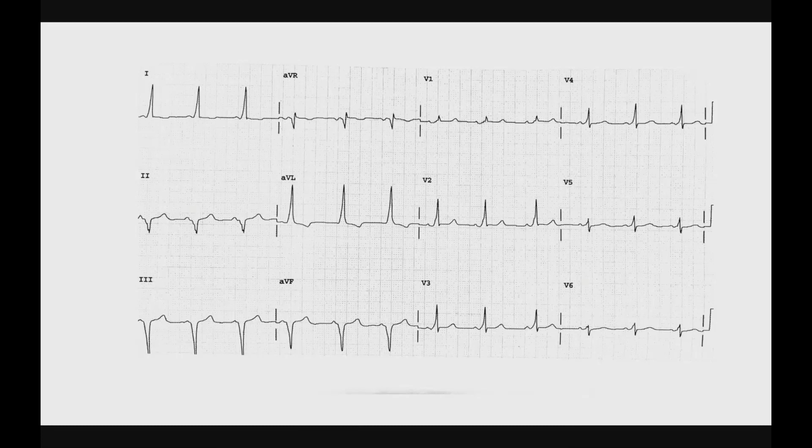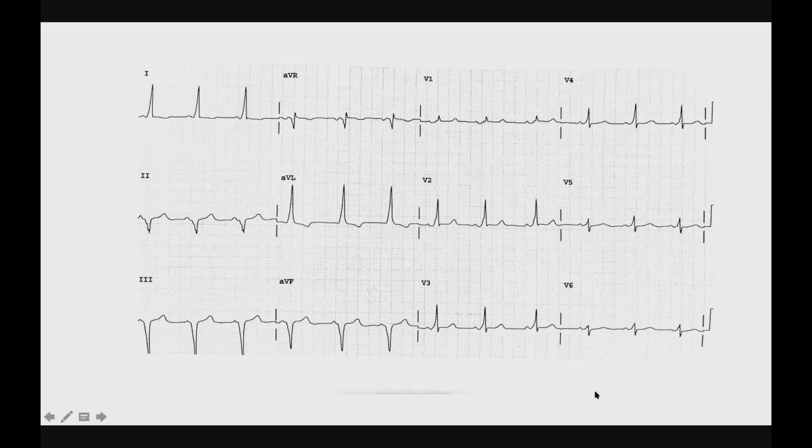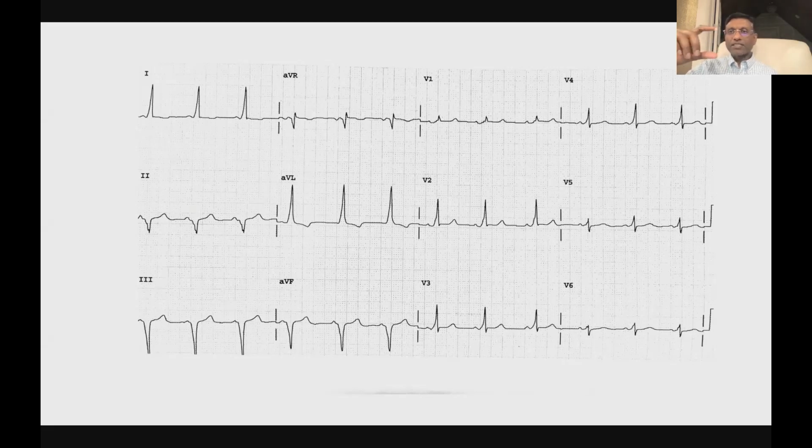Okay. So this is typical of being led down the garden path by someone who's trying to get you to trip up on the EKG in front of you. But remember, the reason I'm not doing sessions of "we're going to do all atrial fibrillation and flutter today, heart block tomorrow, MI the following days" is that in real life you get EKGs at random. So if you're reading, you're going to come across this tracing suddenly.